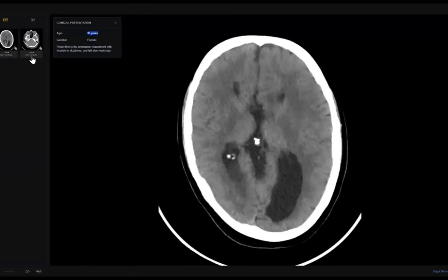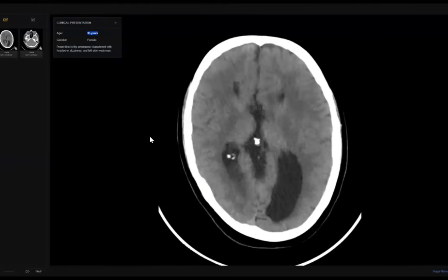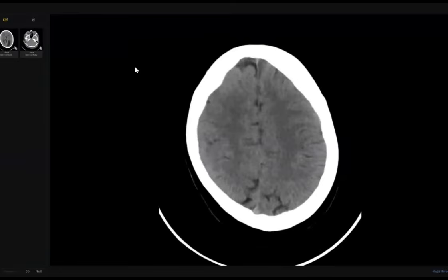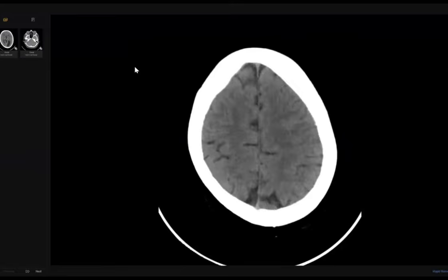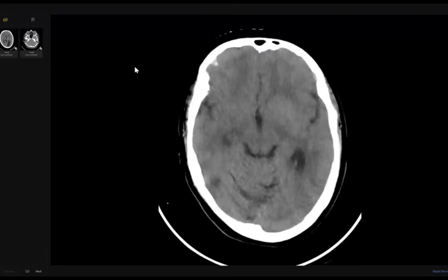Why? The age is adult and the presentation is acute, but finally this is a congenital anomaly. Trust in what your eyes say. This is the advice of this case. You see corpus callosal agenesis, tell the examiner. And after that, while I'm searching for hemorrhage, for any vascular occlusion, I can't find any.